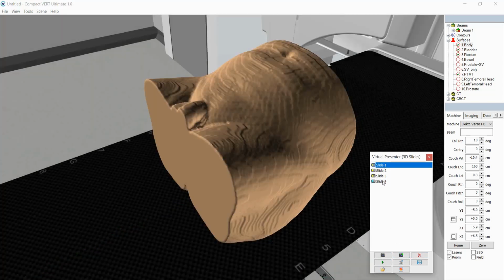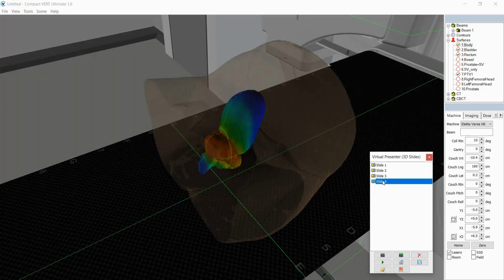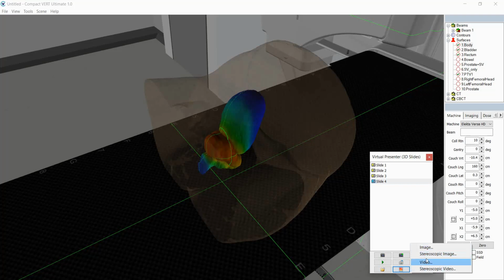You may sometimes find it helpful to add external images or videos to your slideshow. These can be added by clicking on the Media button. You can choose between an image or a video. Images must be in JPEG format, but these can be anything from photographs, diagrams, screen grabs, or PowerPoint slides. Video files are recommended to be in Windows Media Video format.